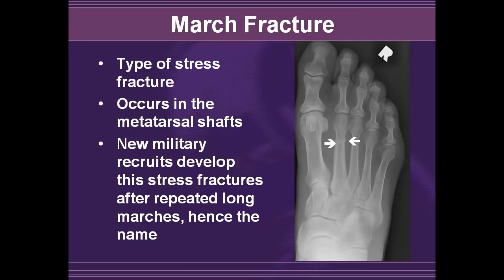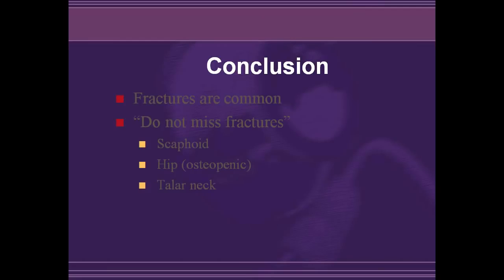Finally, I'll cover a march fracture. Often it's a stress fracture from military recruits marching long distances, and it occurs in the metatarsal shafts, usually near the region of the neck. So, in conclusion, fractures are common.